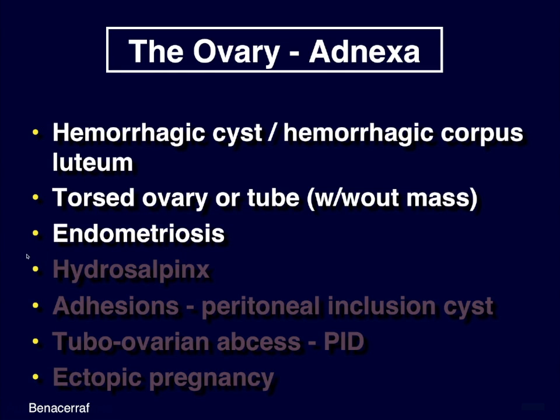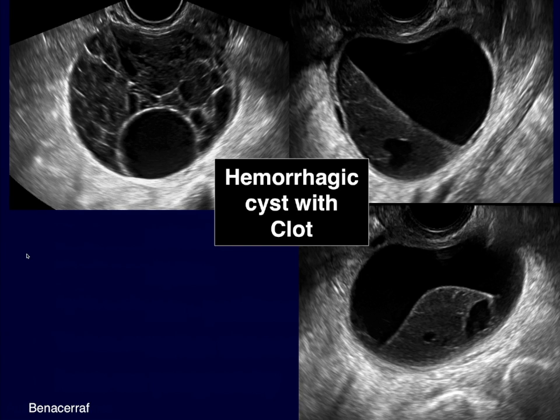And we can start by looking at these cysts that are really quite characteristic of the hemorrhagic cyst. You can see that all three of them, and these are three different patients, have a very reticular-like pattern of the material inside the cyst.